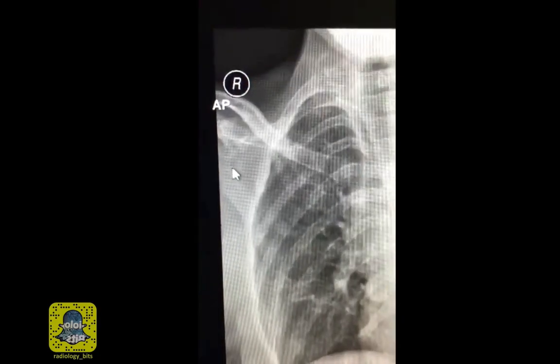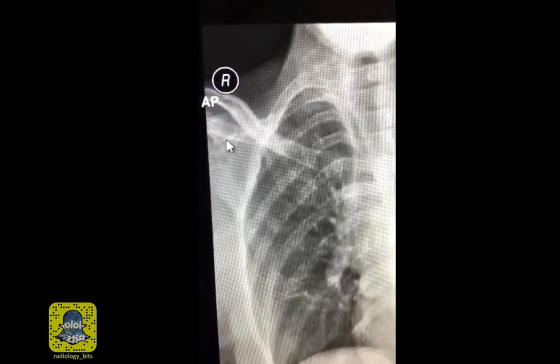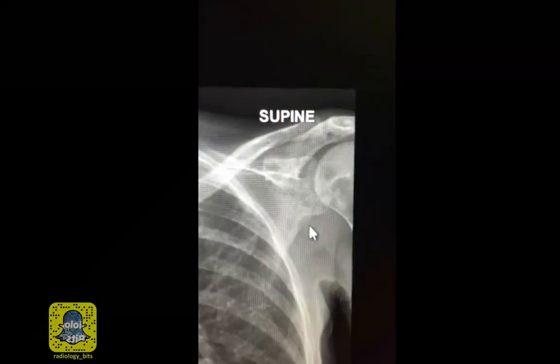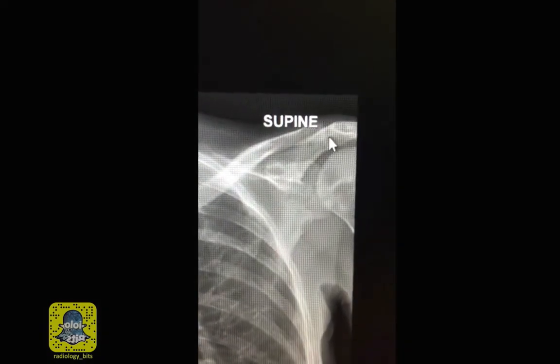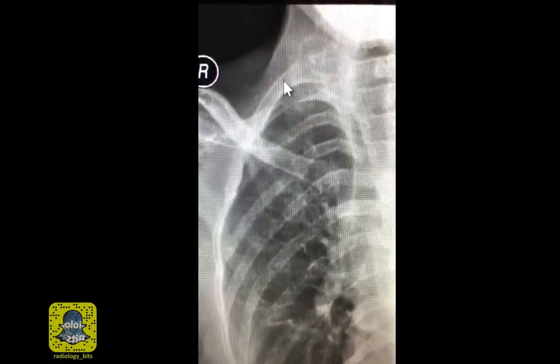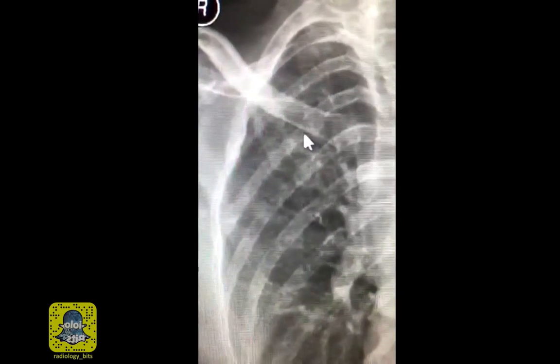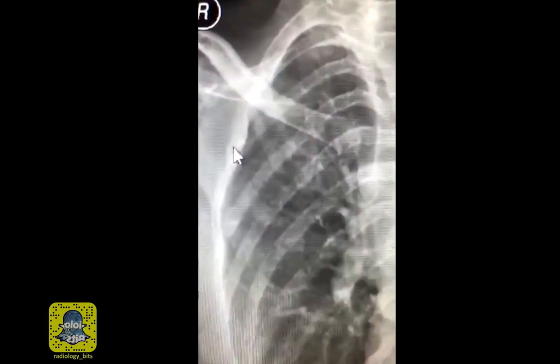Now that you're looking more carefully, you'd have to wonder about these areas of darkness, these lucent areas in the right scapula, another lucent area within the right clavicle, additional lucencies involving the left scapula here, as well as this part there. And even more questionable lucencies within the ribs, such as this area here, this ill-defined darkness in this part of the first rib there. Looking more carefully, you'd question these expansile lytic areas involving the ribs, such as here, there, and there.